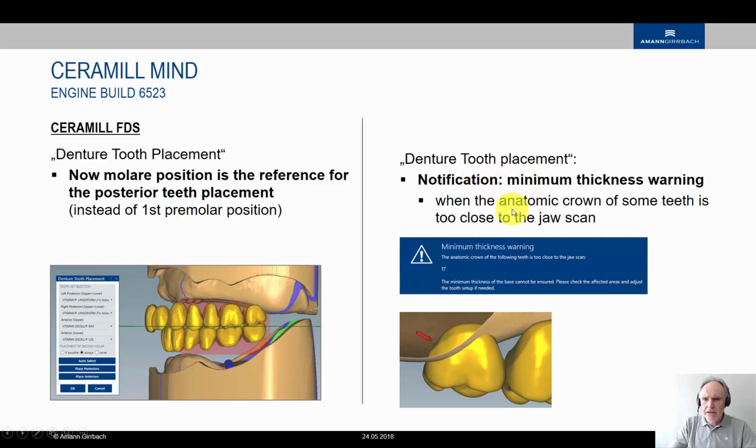There is another thing now. You get a notification if you have no space or too little space between your teeth and your jaw situation here. So you get a warning, and you have two options. We will come to that later on.